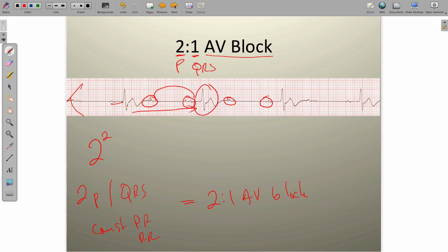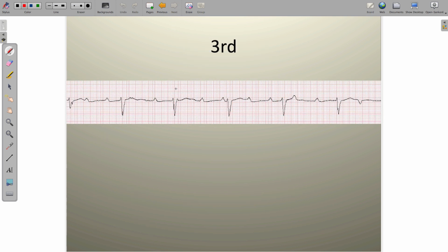All right, let's talk about the next guy here. Next guy is going to be the last guy. So the last guy is, you quickly look at the EKG and you scan it, and you'll notice that, in fact, we have P waves that occur here. Now, I'm just going to point out the P waves that are obvious, super obvious. And then we're going to go back for a second, and we're going to say, hey, this P to P interval is cool, but then look, something happens here. And then something happens here. We get another P wave. So what's happened here? This is actually a P buried inside the T wave.